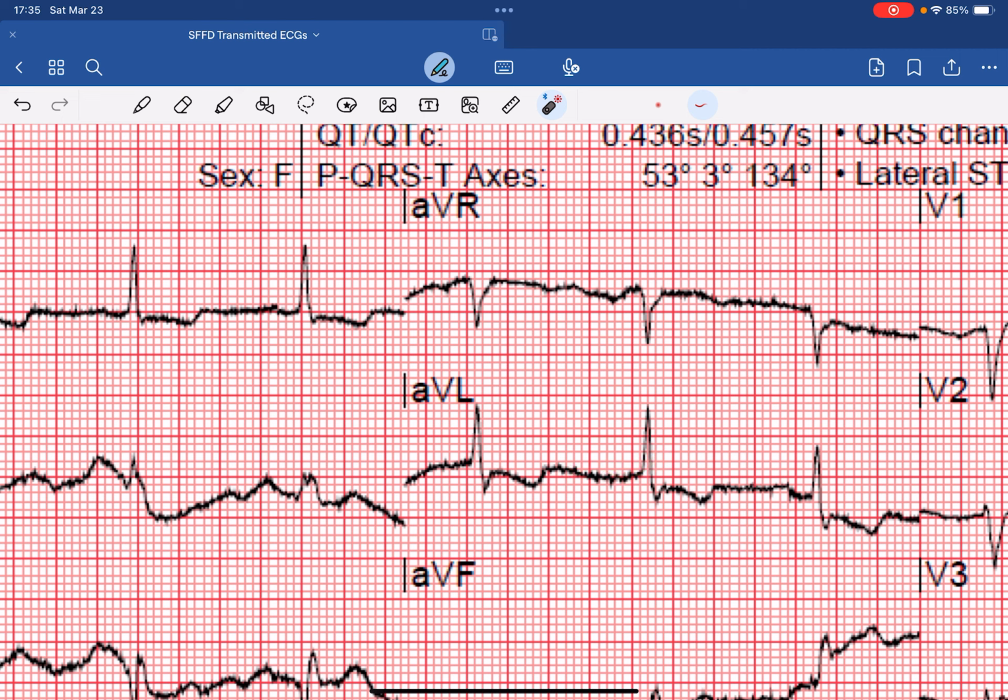And part of that is this sloping, scooping looking T wave, as it starts off low, below the would-be line, and then slopes back up. That is a good indication of an ischemic change or a reciprocal change. And then again in aVL, anytime your T waves are inverted in aVL, you should be concerned. If you have T wave inversion with what looks like some ST depression, granted, the baseline's a little off, so this is maybe 0.5 to 1 millimeter of ST depression.